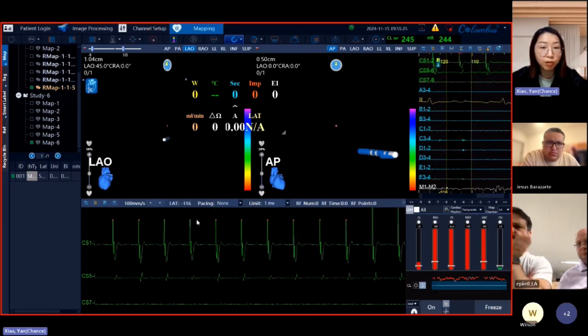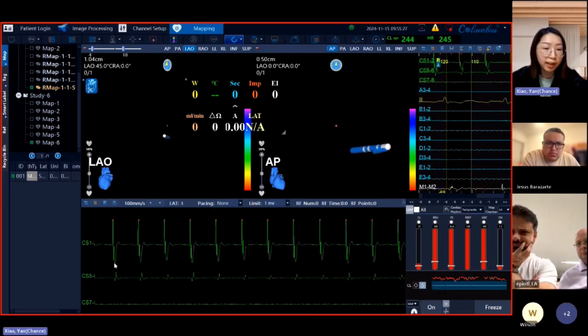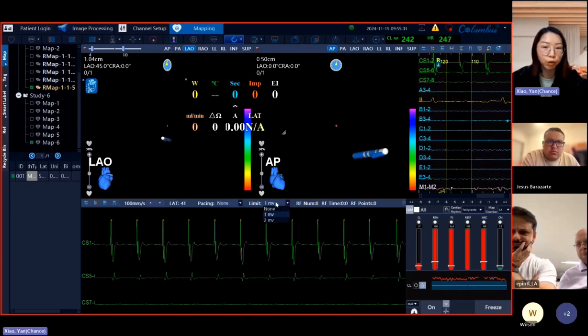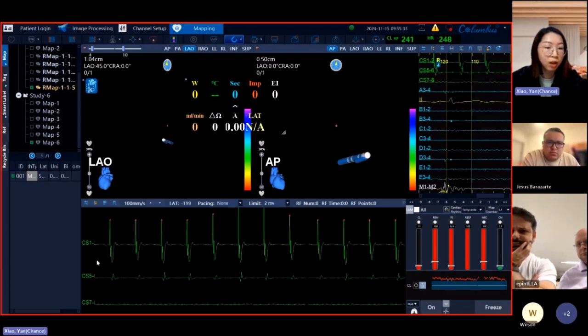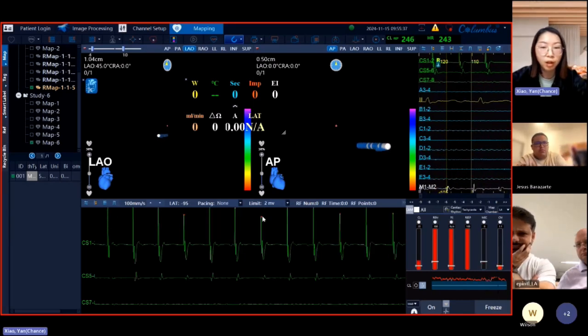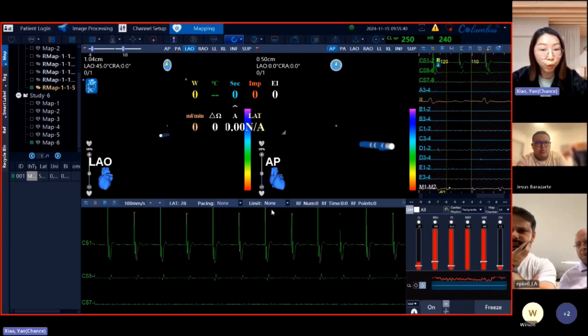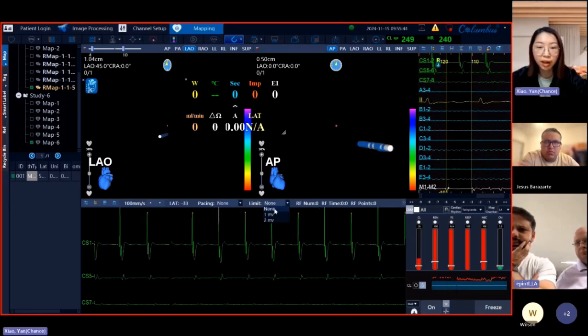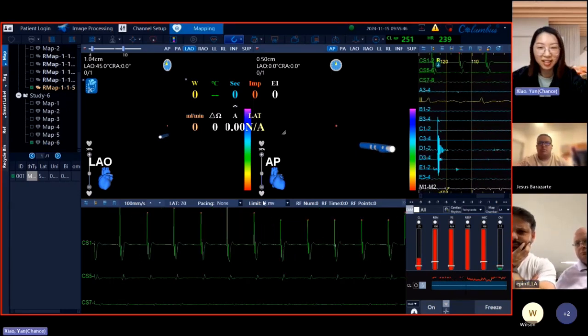When I set 1 millivolt, the range will be negative 1 millivolt to positive 1 millivolt. If you choose 2, it's the same, from negative 2 millivolts to positive 2 millivolts. Of course, you can turn it off quickly from here.